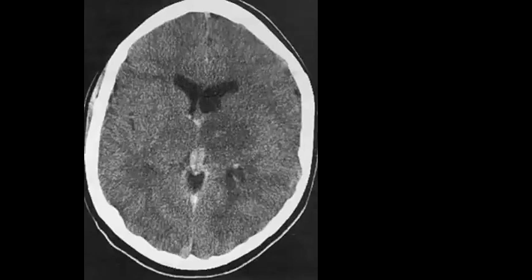Let's go to the next case, which is a neuro case. So our participants, Huda, 130, Zoom user. Okay, there are some hidden names. What do you think about this brain, CT brain? And it is non-enhanced, no contrast in this CT brain.